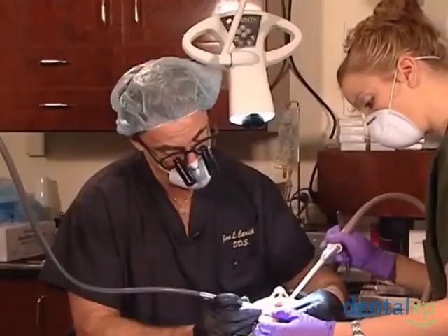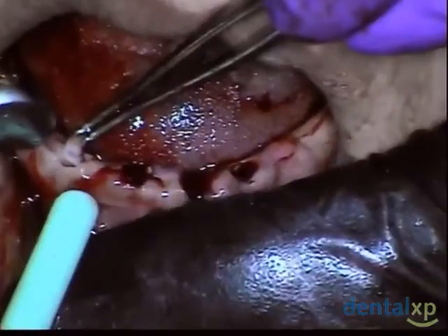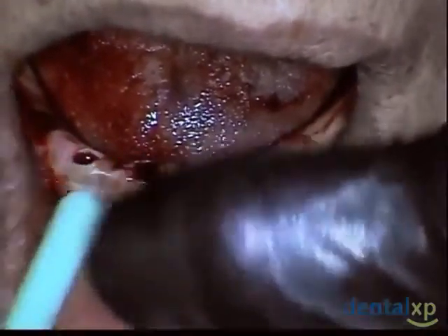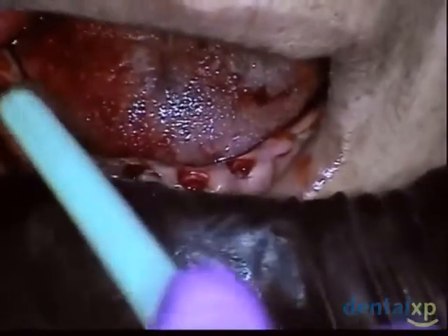If you have an implant that you're going to place, a conventional implant, in the ERA abutment, they come in cuff heights. The implant itself, the ERA implant, has the part of female attached, or incorporated in the implant itself.